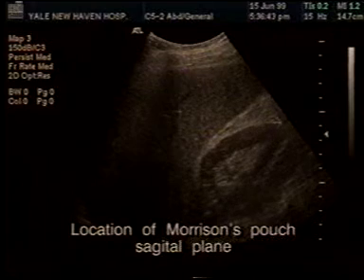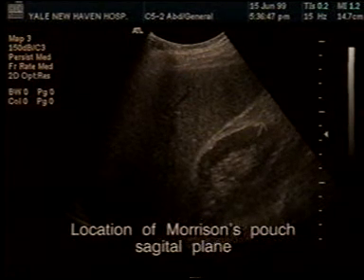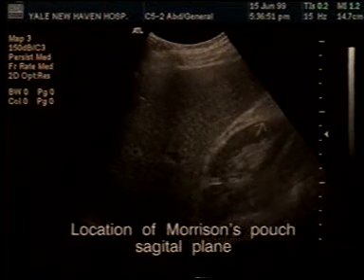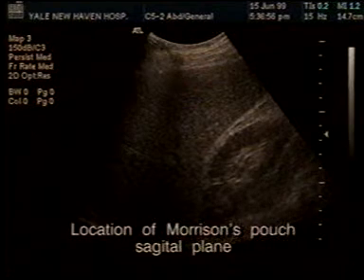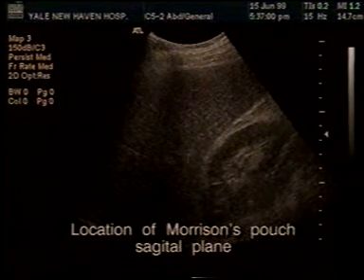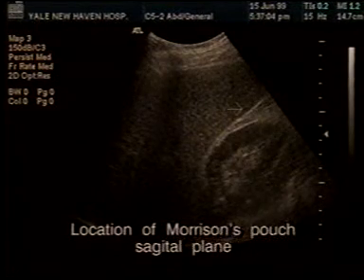So in between these 2 layers of the peritoneum is a potential space, and in the supine position, which patients who have just had a bad accident happen to be, this is the lowest part of the peritoneal cavity, and therefore fluid will be seen in this hepatorenal pouch of Morrison's pouch.